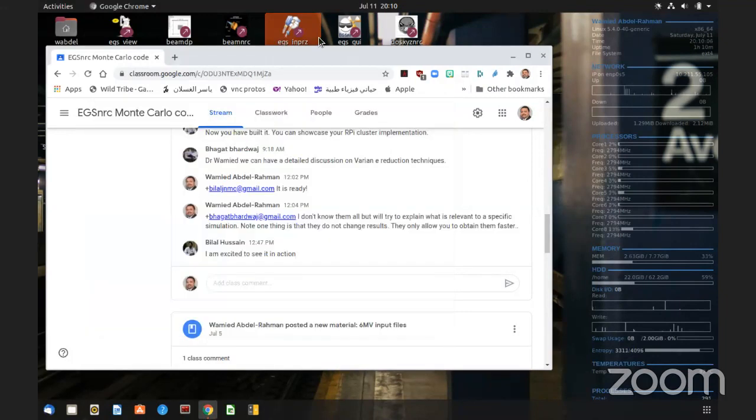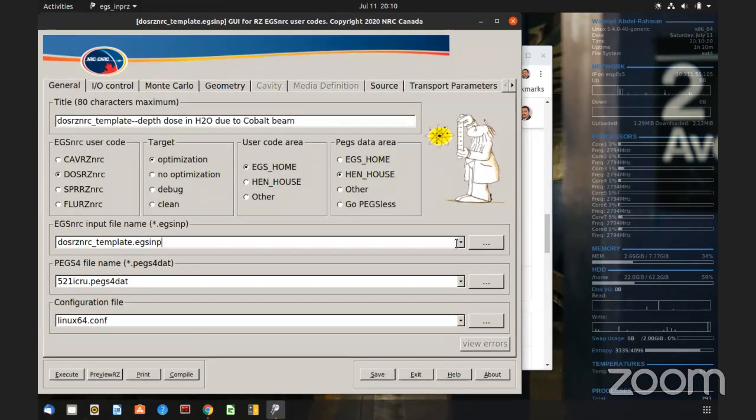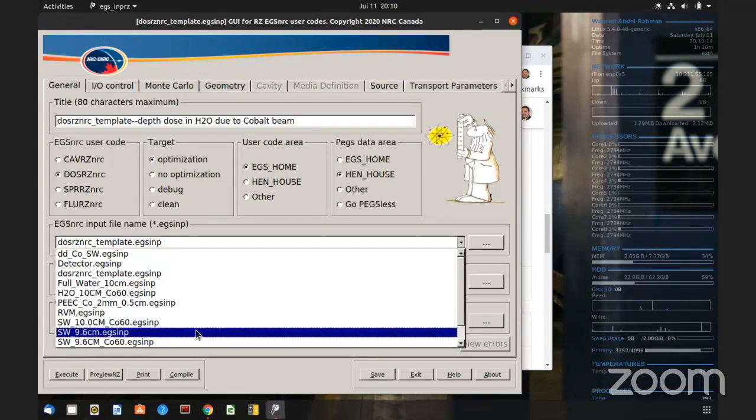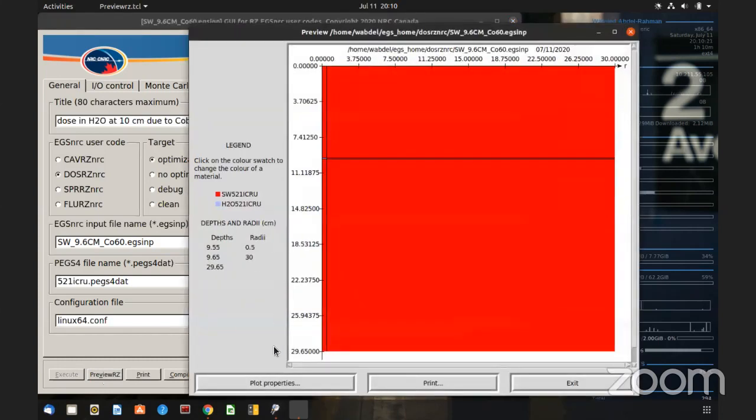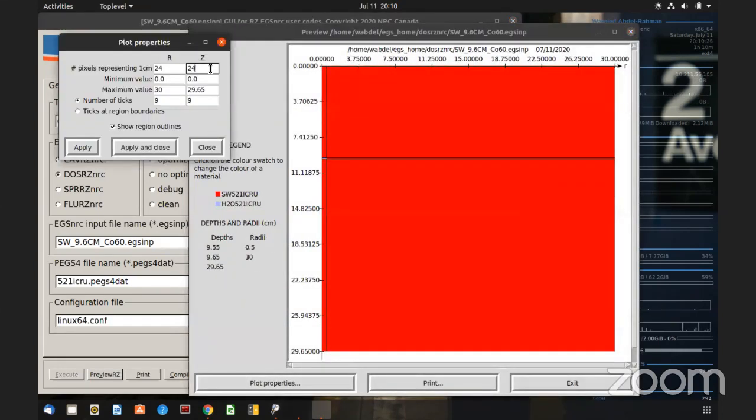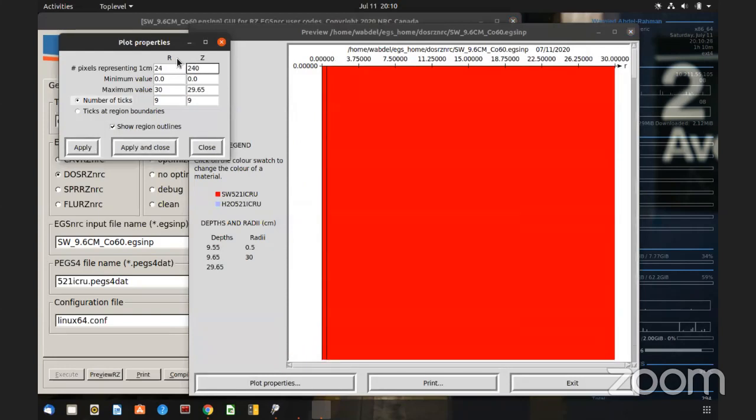Now, the next step is I went and made this, okay? And let's look at the preview. Okay, I hope now it's clear, or you can see the difference. See what I have done. I'm going to put this on zero. Okay.